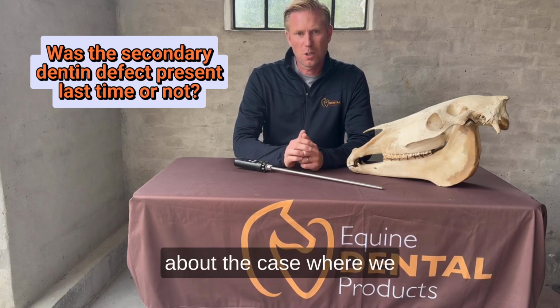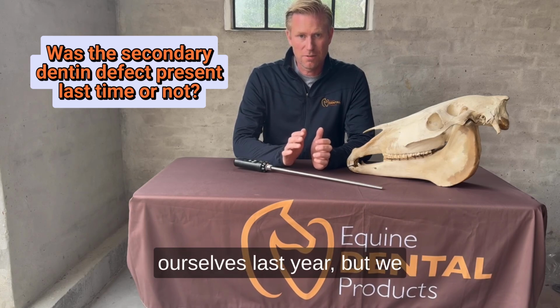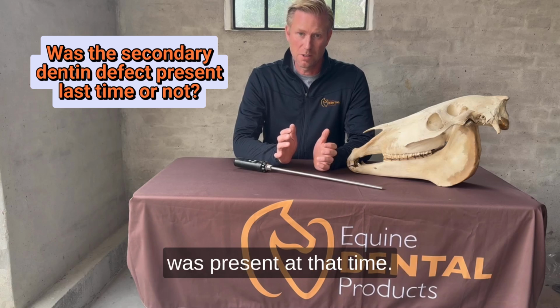In this video I want to talk about the case where we find something on the tooth and we did the examinations ourselves last year, but we don't know if the same thing was present at that time.